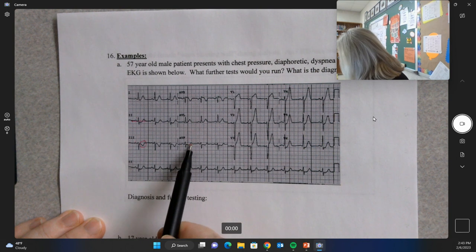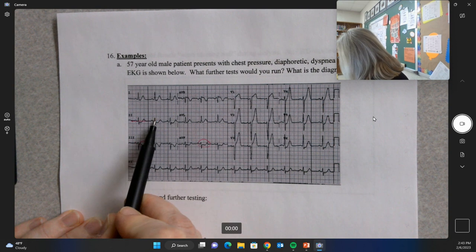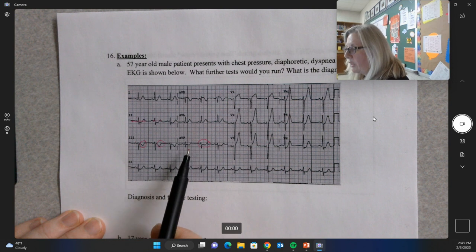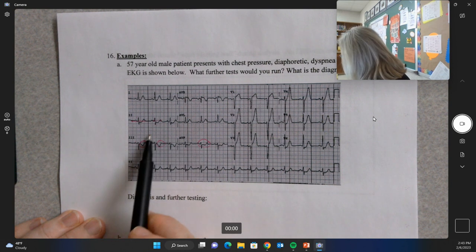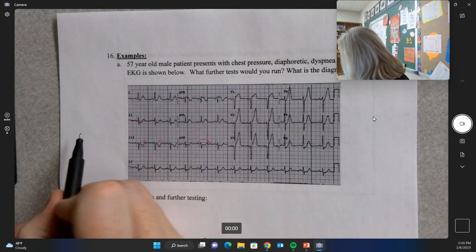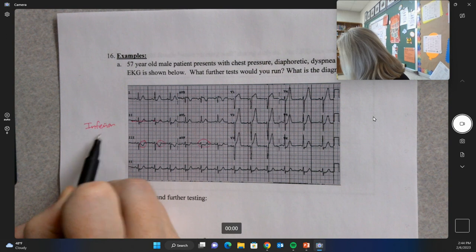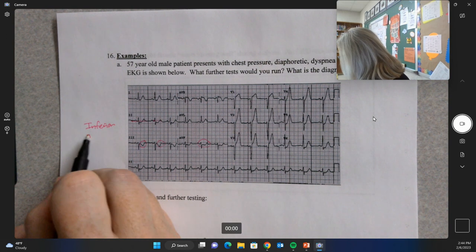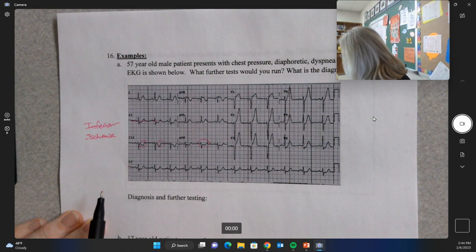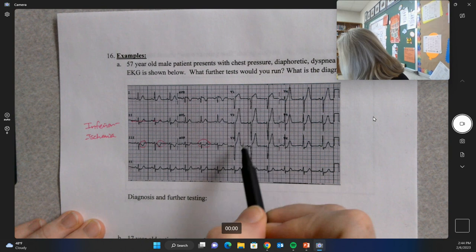And over here, it looks like ST depression as well. So I do have changes in, looks like, 3 of the leads. So if I have ST depression and/or T-wave inversion in these 3, I'm going to say the inferior, it's inferior, right, has ischemia. Most likely ischemia. Okay. So when I look over here, I'm going to look at V1, V2, V3, and V4.